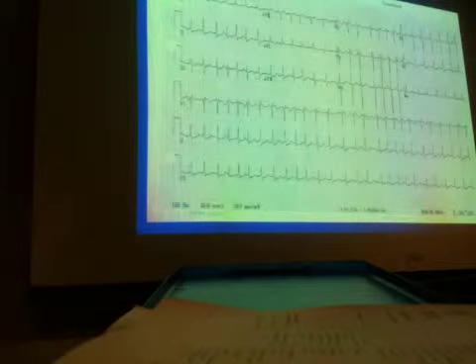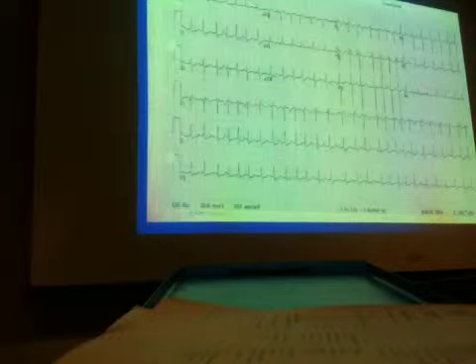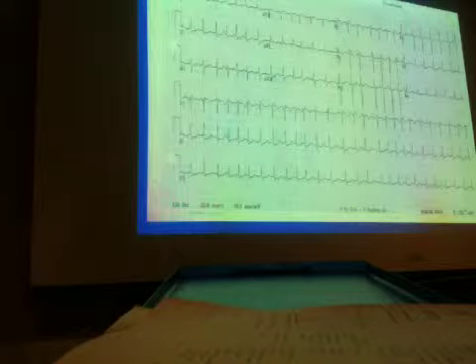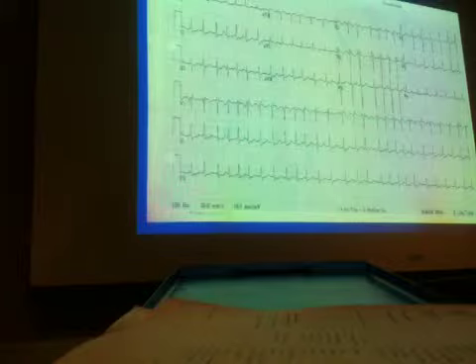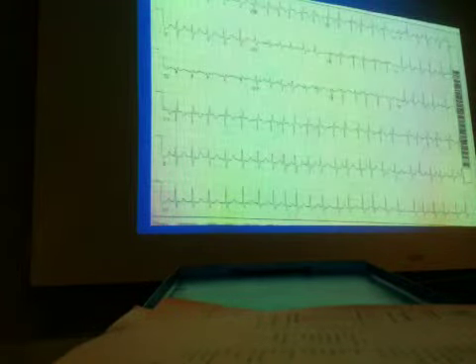Heart rate of 161. That's the classic thing you'll see, especially if you work in the emergency room, okay? Or even on the orthopedic floor after surgery, all of a sudden, oh my God, this patient's heart is very fast, it's very irregular. Get an EKG, you probably see something like that, okay? Irregular, no P waves. And typically fast. Atrial fibrillation. Okay? What do you think this is?